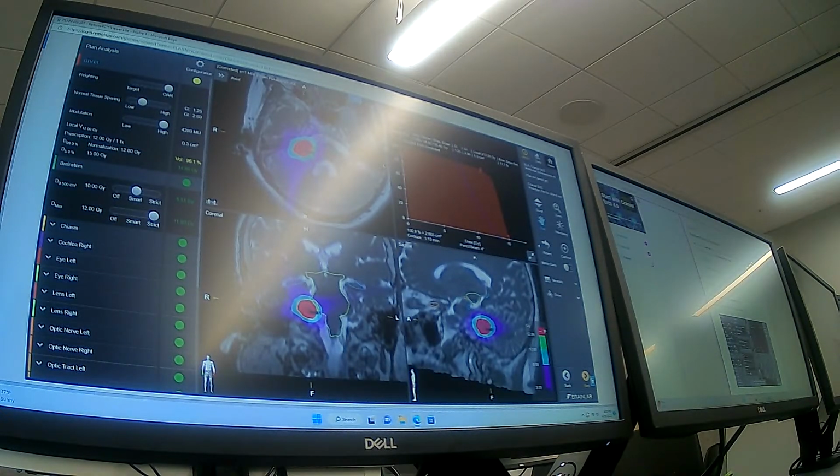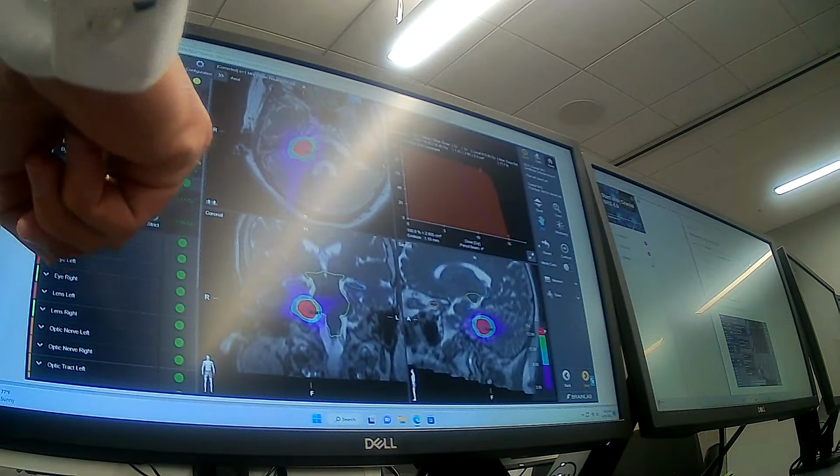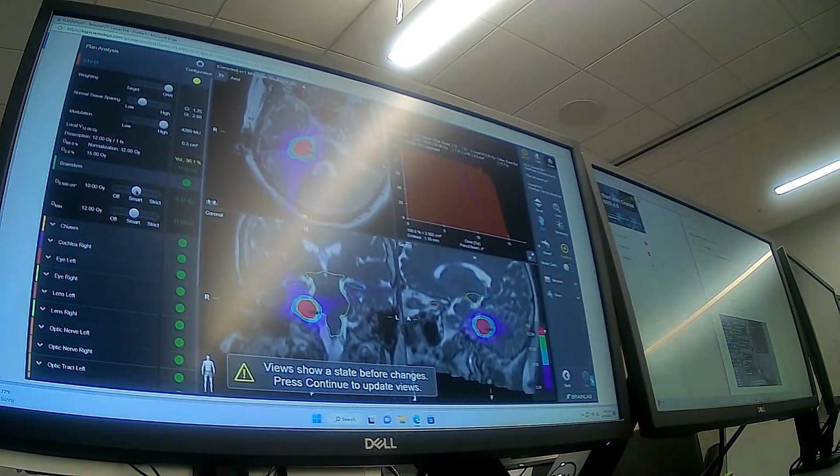It's still not, my thing right now still is I moved to 4 arcs, and my thing still is just getting the volume. So it's yellow. What are you at, 96.1%? Yeah, so you have this strict, right, on your D max. So put that back to smart and move this one to strict.